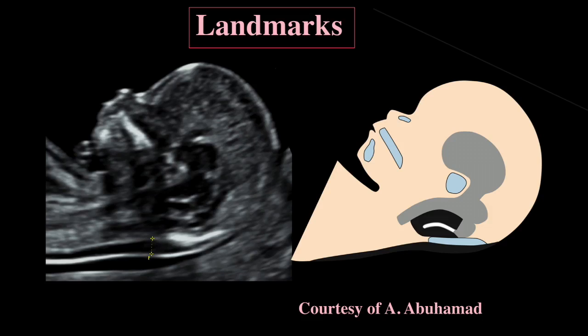So the face is an incredibly important place to look in the first trimester, and you're really forced to look at it anyway because you're looking at the nasal bone typically if you're doing a nuchal translucency, so you're already there. And while you're there, you need to look very carefully at some of the landmarks that we've already talked about to a certain extent.